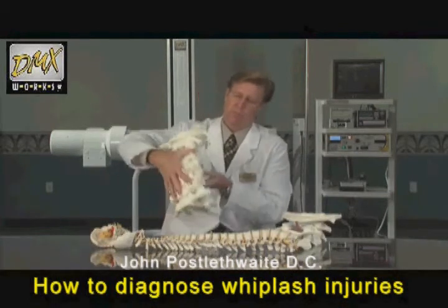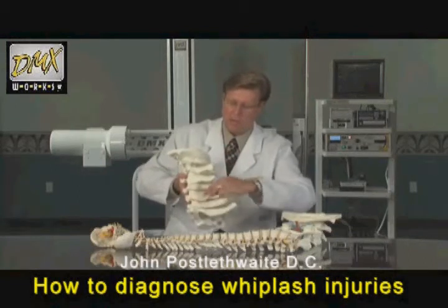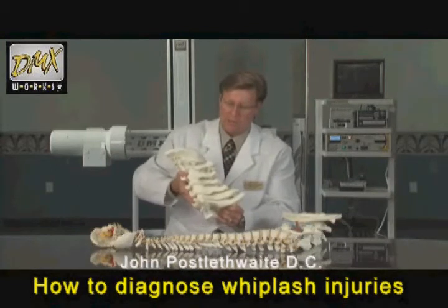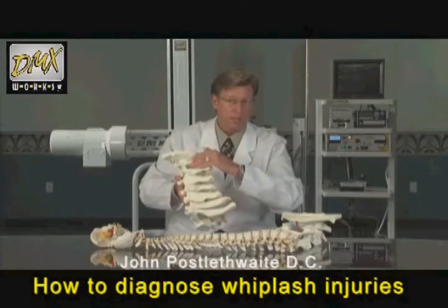Also, when I flip the big bones over, there are no discs in the back of the neck. There are these joints that allow us to turn and twist our neck. These are only held together by ligaments.